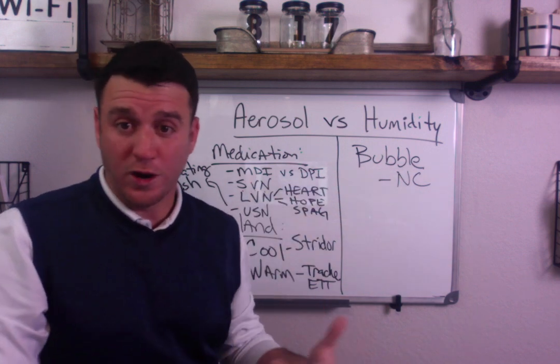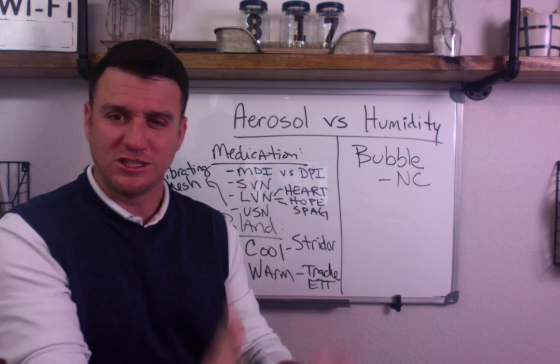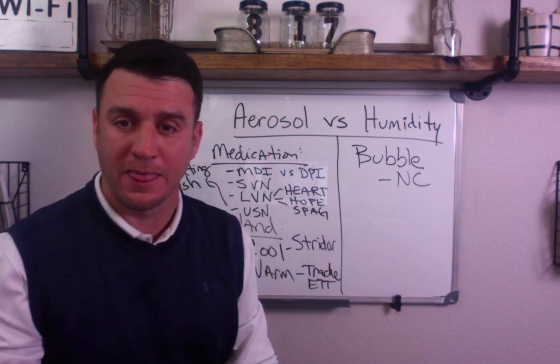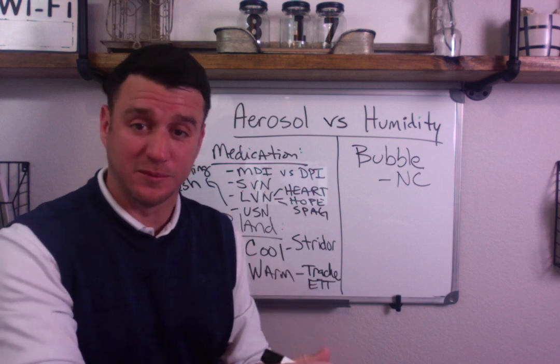Again, hook one up. Look at the nasal cannula. Can you see the humidification coming out of it? Absolutely not, because humidity is not visible.